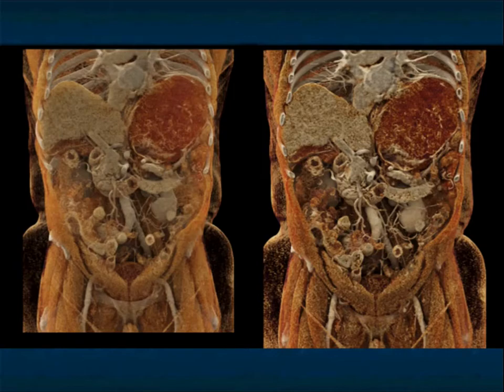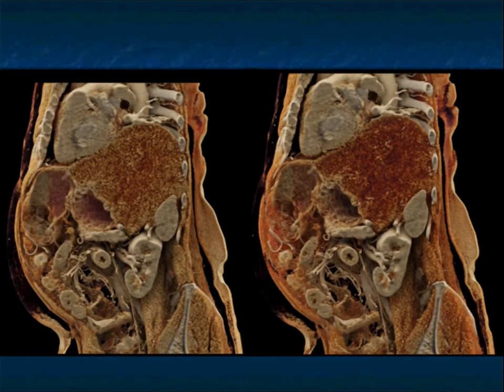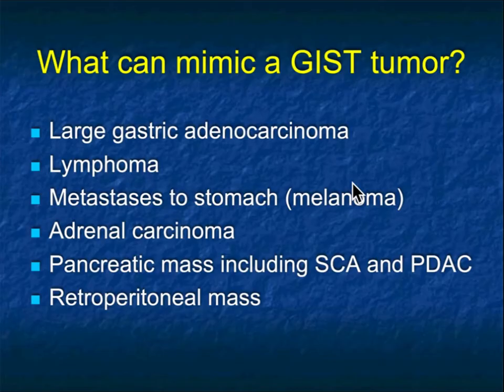So a really good example of specifically what is going on in terms of tumor and tumor necrosis. So again, whenever we scan a patient with a GIST tumor, you're scanning the entire abdomen and pelvis, looking for any of these possible zones where tumor extension can be seen. And again, you can see the texture of the patient's tumor very nicely shown.